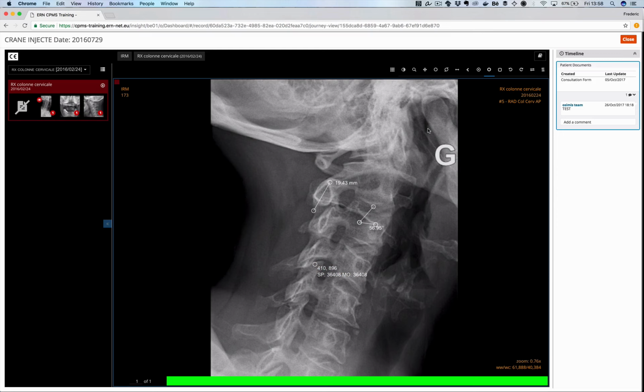Now I can do 2 regions of interest. It's either an elliptic region of interest or a rectangular region of interest. I can remove these annotations only by selecting the tool that I want to delete. So if I want to delete this rectangular region of interest, I have to pull it out of the viewport. If I want to remove this elliptical region of interest, I have to drag it out of the viewport, but I of course have to select the feature itself first.